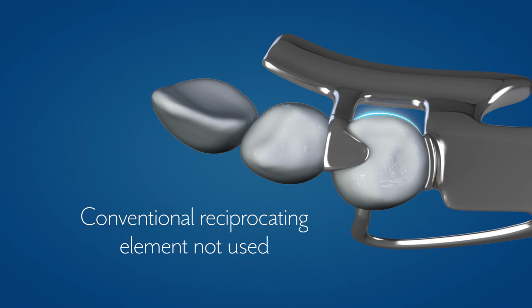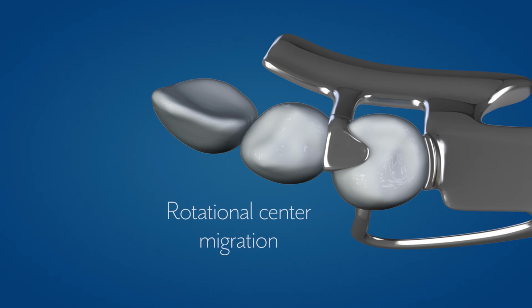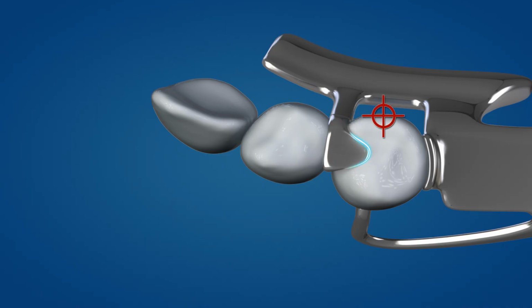This refers to both reciprocal arms and lingual plating. If there is contact with the abutment above the lingual height of contour, there will be a migration of the rotational center away from its intended position at the mesio-occlusal rest and toward the distal of the tooth. This would alter the desired mechanics, preventing clasp release and producing an undesirable rotational or torquing force within the abutment.